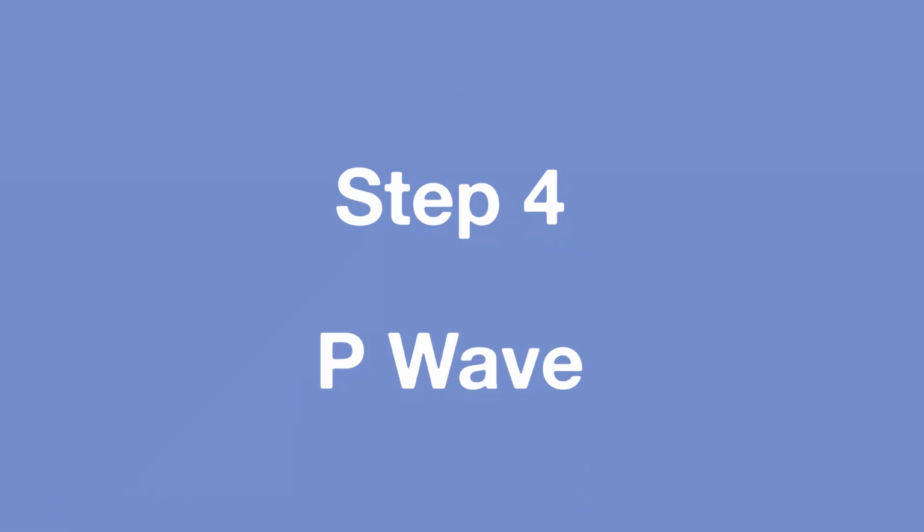Now we're going to move on to step 3. Step 3 is reporting on the cardiac axis. I talked about axis deviation in ECG guide number 3, so all you need to do is recap on that. Essentially what you're looking at is whether the R waves are pointing towards each other, which would represent a right axis deviation, or if they're going away from each other, then it represents a left axis deviation.